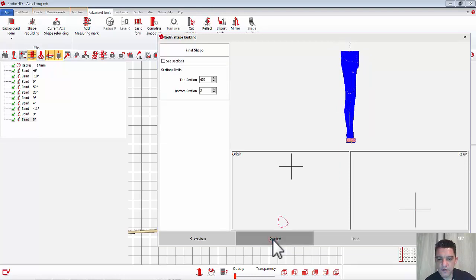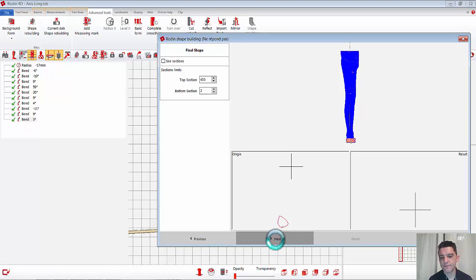So this is like I try to explain to many people, that for me the combination of Neo and Cube softwares is amazing, because you can see here we have a button to import in Cube, so you can quick take from Neo, go to Cube, do some things, import again in Neo, and you can do very many things. Oh, I click when the computer was thinking, so I don't know. We will see.